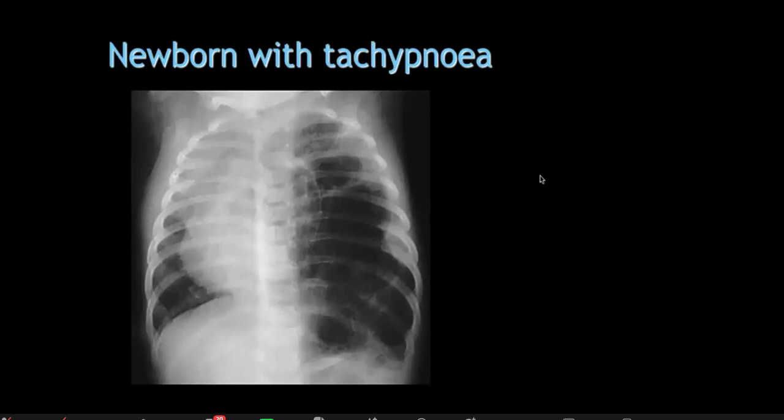Sorry, so this is a frontal chest radiograph of what I'm told is a newborn infant patient. The striking abnormality is in the left hemithorax, where there is increased translucency and absence of the normal lung markings with enlarged cystic spaces. My primary differential is a CPAM on the left, but I would also include in the differential diagnosis large congenital diaphragmatic hernia. I would recommend that the patient could have an ultrasound scan, cross-sectional imaging for further evaluation.